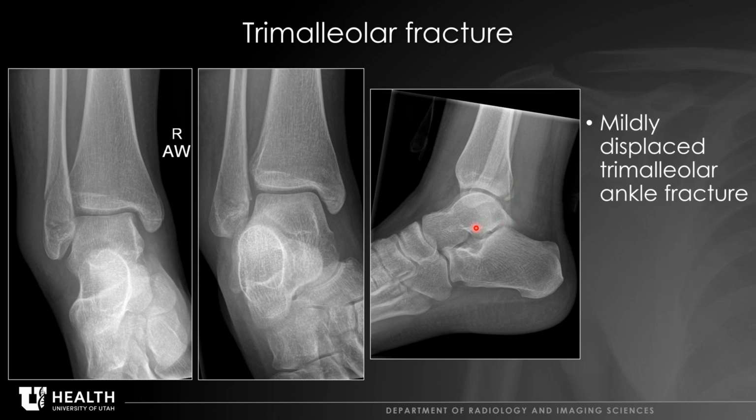Depending on where you are in the country, how it's described varies. Here at the University of Utah, any fracture that involves the posterior aspect of the tibia, we are calling trimalleolar fractures or posterior malleolus fracture. Or I did my residency in Milwaukee at the Medical College of Wisconsin. If it wasn't a large fracture fragment involving the posterior malleolus, we didn't call it a trimalleolar fracture. And then here we're seeing this fracture of the lateral malleolus or distal fibula.